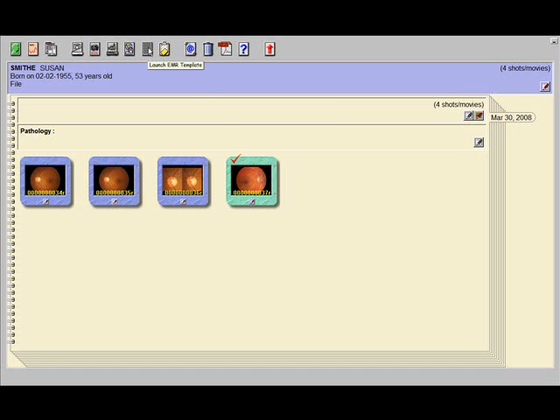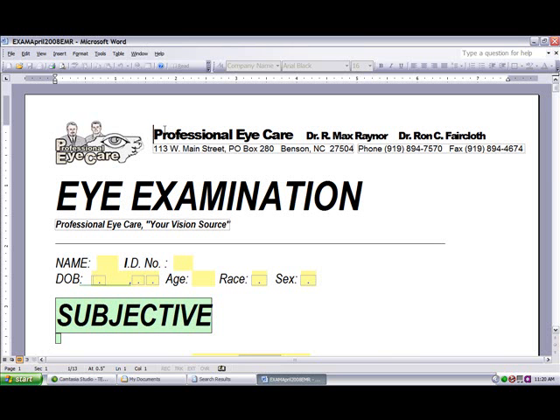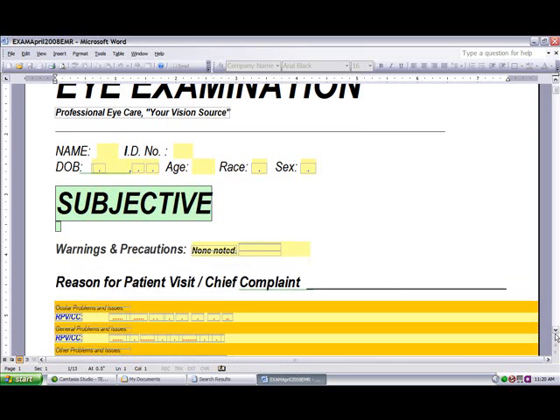In the future, we will have advanced EMR templates. As you see, we will have a complete set of templates to handle most of your simple EMR needs.